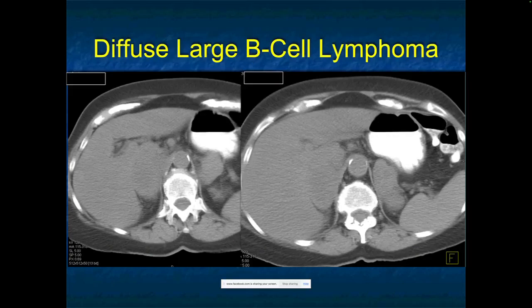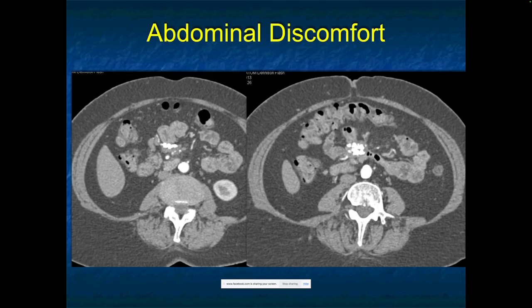This was B-cell lymphoma. Now, most of the cases I have, and there are not a lot of cases, the lymphoma involvement of the adrenal is really, really large. But in this case, it's pretty good, and that was B-cell lymphoma. So again, think of METs, think of primary ACC, think of PHEOs, which are bilateral, but you need other findings, of course, from elevated epinephrine levels to vascular lesions, which these aren't, of course. And so always keep that lymphoma diagnosis in your back pocket. Another case, mass in the mesentery.